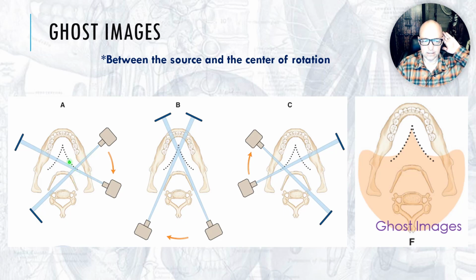And when it starts, this is the point of rotation. As it's moving around, that point of rotation moves in this V shape. So each of these little dots represents that moving point of rotation. So that's the start of the image. And then it continues around like this, and this shows halfway through the image.